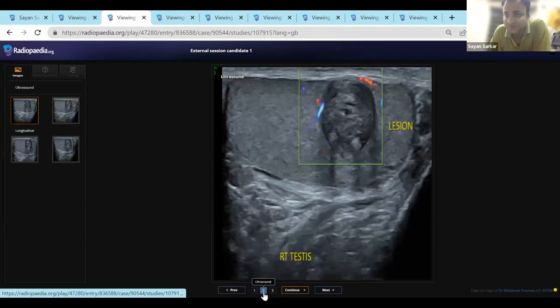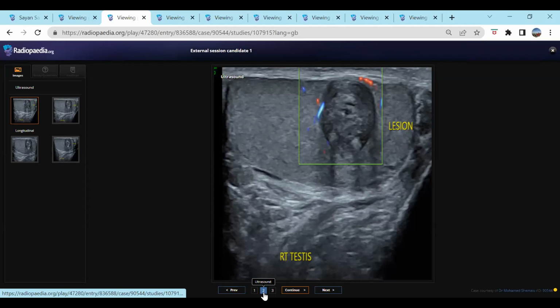This was actually a bit surprising for me because I think you did really well in the other cases. I don't know why you went in a different direction on this one. This is actually a classic epidermoid cyst. There are no DDs for this. It's absolutely an epidermoid.